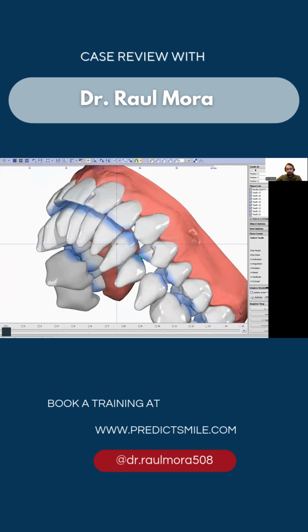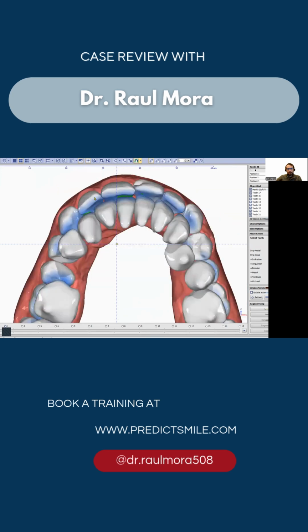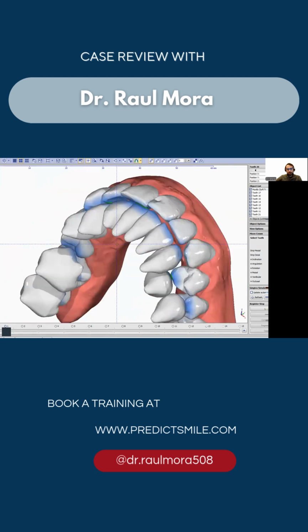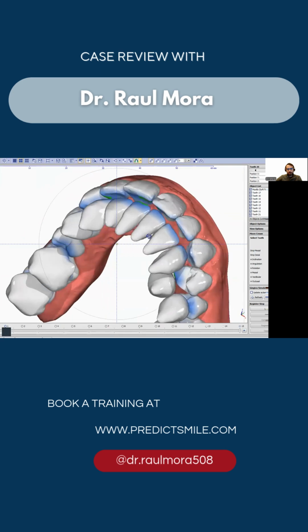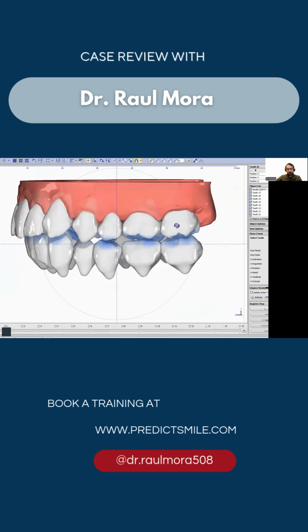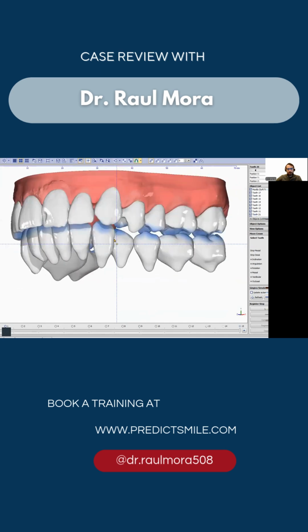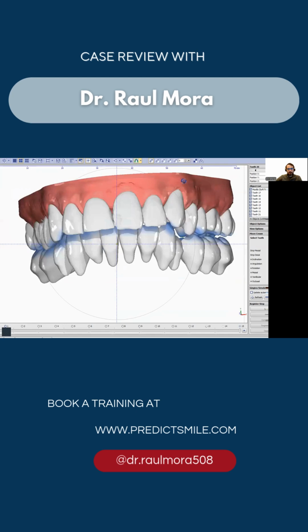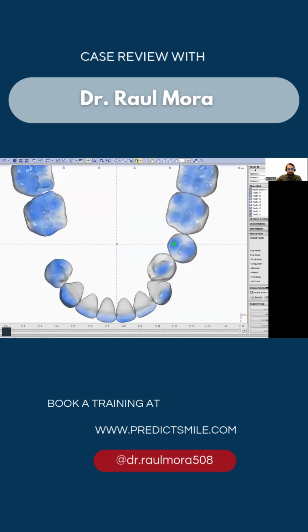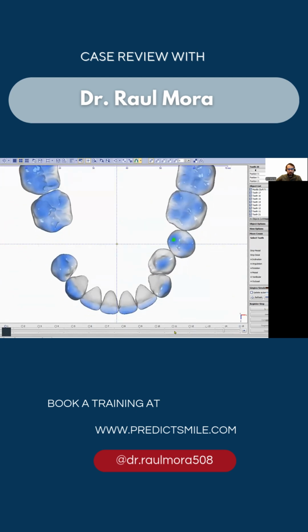So we're going to start with the upper arch to relieve these contacts and these other contacts so we can create some sort of bite jump when we release them and close the posterior bite. You can see there's no contacts in the posterior segment. We're not going to fix this crossbite as it was only requested to make the anterior segment. So let's see how we are going to work it out.